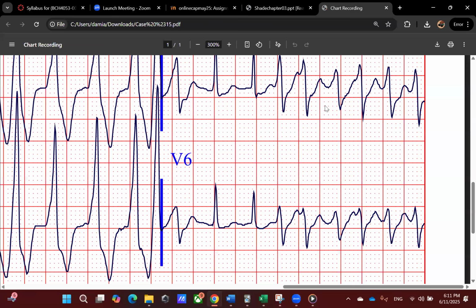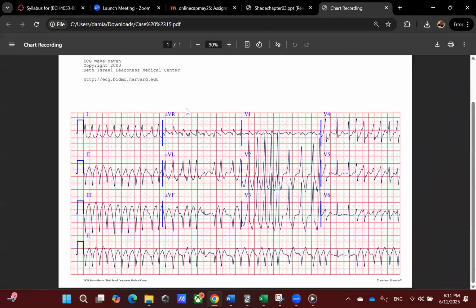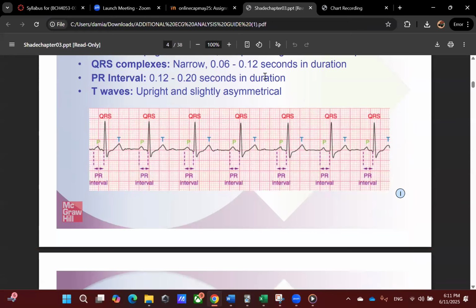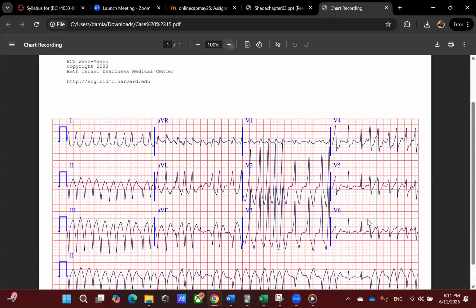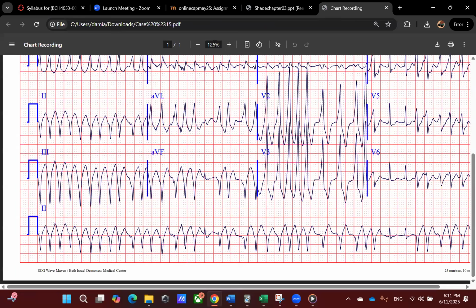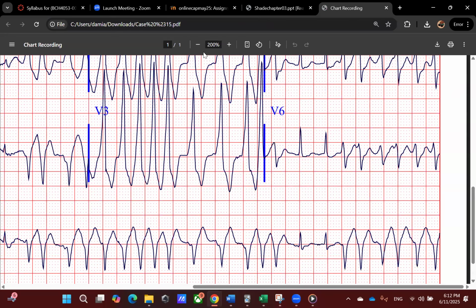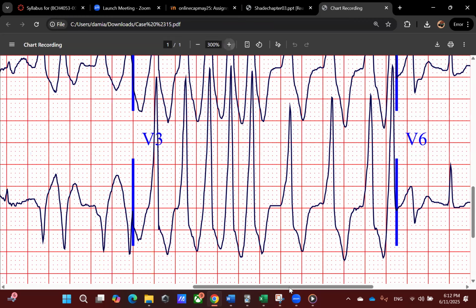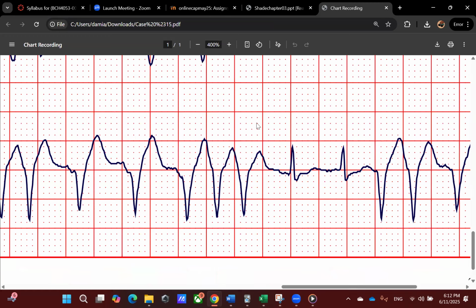Now, in regards to our drawing, I started it initially just trying to analyze everything, but then I got a little confused. So then I went in depth into here, and I finally understood it. I was looking for that QRS complex and for the calculations of this experiment, and those happen to be around here in lead 2. You can see the complex. I'll zoom in a little bit more here. So this is the one I utilized.